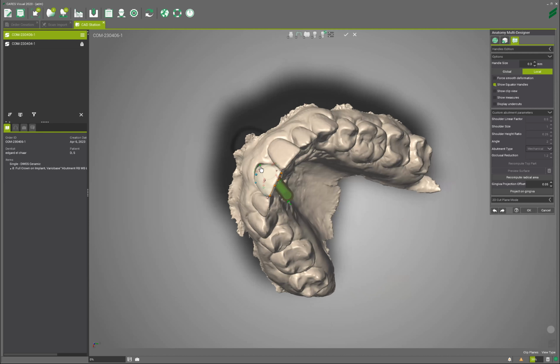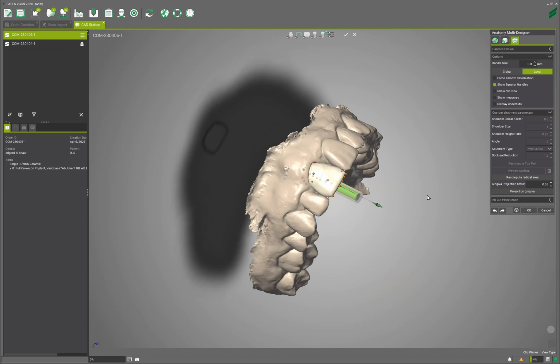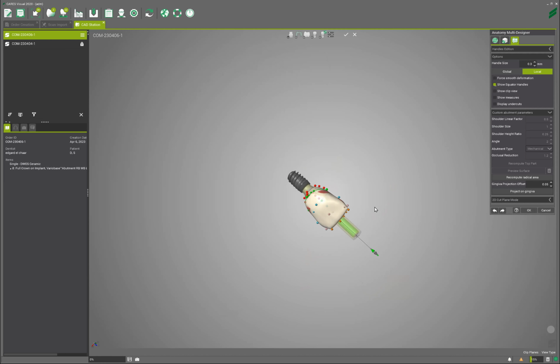And this is where the gap is, and don't forget, I made that socket. You know, the accuracy is, so we'll do our best, but keep in mind that this is not as natural.